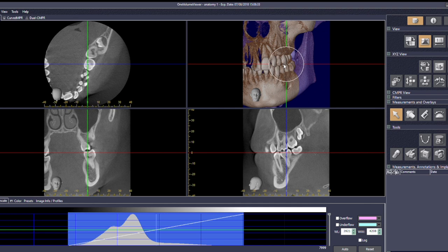Now you'll notice that for each of these images, there's a tiny little human head shown in the corners. And this is to orientate and remind yourself where you are. So let me just show you this one. We can see in this view, this is what an axial slice is. And this is if we took slices through the patient from head to toes. In this particular case, the patient's nose is pointing down.